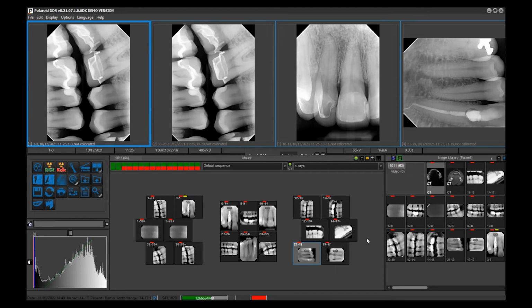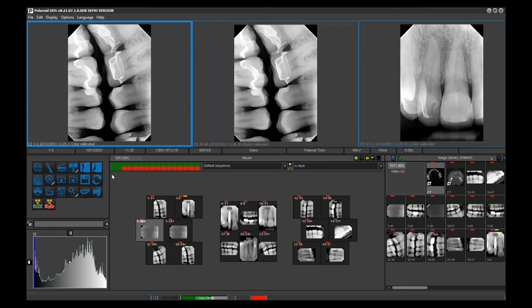Yes, and I just grab some random ones from my whole set. I can change that view. Normally the orientation would be correct. These are just sample dummy images that were dropped into the blanks. Right, so I can change that from a 4 view to a 3.